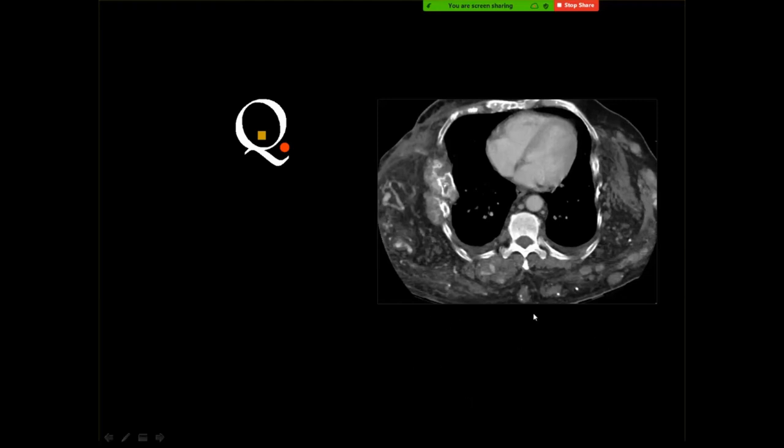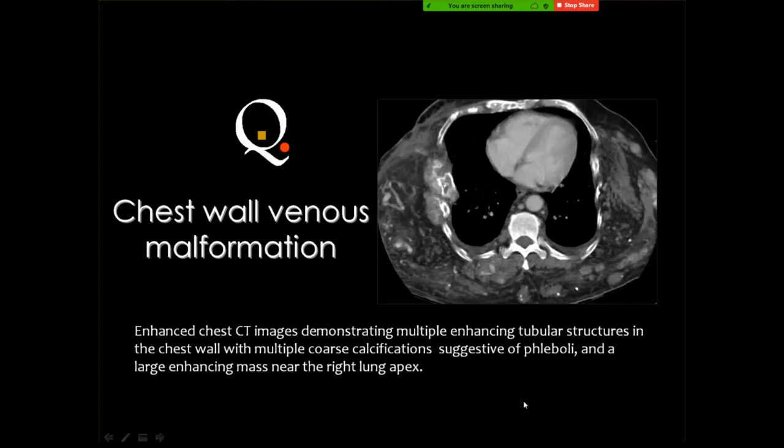Did you look carefully for these calcific foci? Hemangioma? Yes, it's a very big venous malformation. The new name of hemangioma is venous malformation, and it is diagnosed by the presence of calcific phleboliths. Wherever a hemangioma is present, you can spot the diagnosis by these minute calcifications.